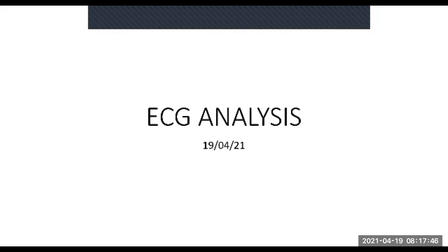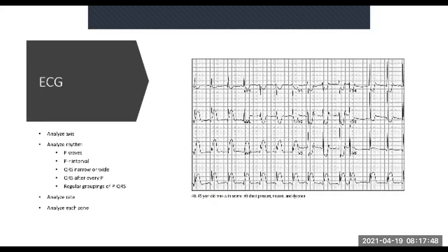So let's just have a look first, just a reminder. Okay. So it looks scary. All right, but you're going to get through it. And just adjust this a little bit.